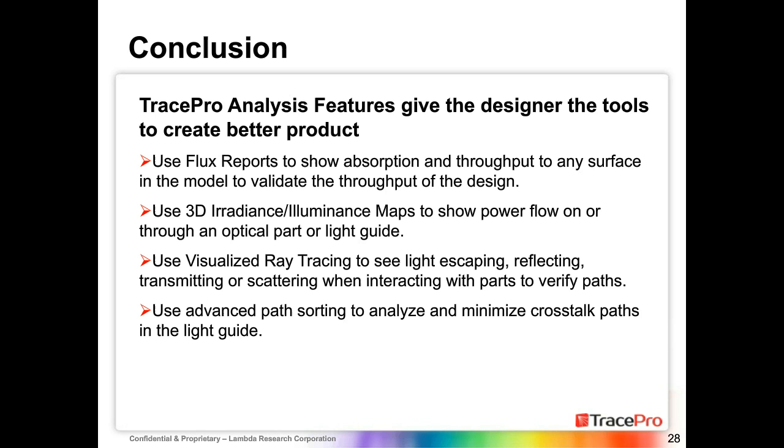Finally, you can use advanced path sorting to analyze and minimize crosstalk paths in the light guide. You can look at each one separately and see that contribution. So this is the type of features that TracePro gives you to quickly virtual prototype and get better answers.